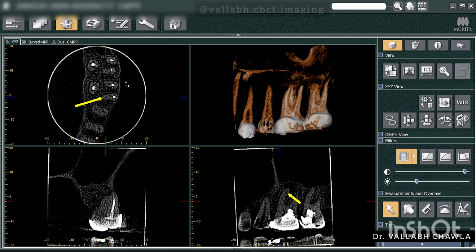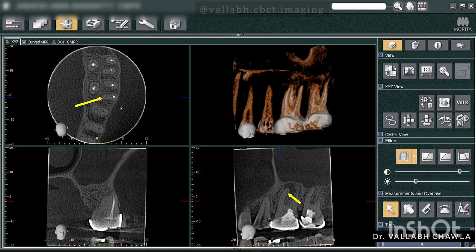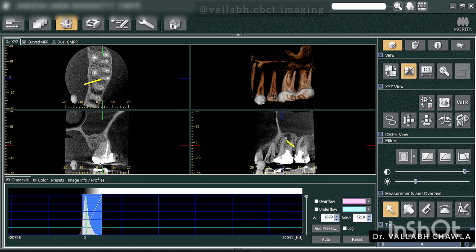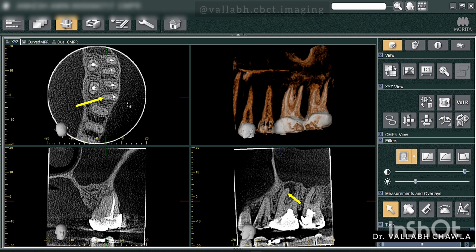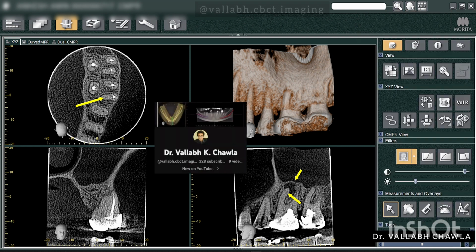Getting back to 0.5 mm, you can always view the same by decreasing or increasing the contrast, darkening or brightening the image. Also, you can use the help of the histogram. You can also apply or decrease the sharpness filter. It is always better to keep the best filter possible when studying endodontic scans, and always have sharpened, crisp images, as you can see in this. Okay, so this was all about MB2 canal evidence. Okay, thank you so much.